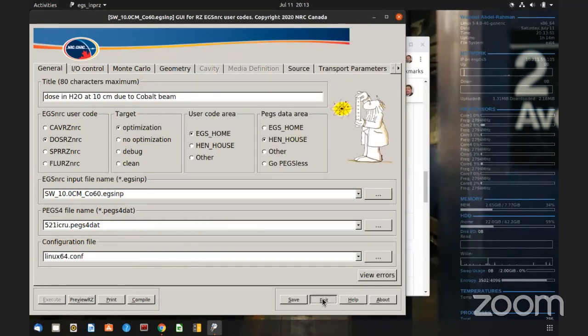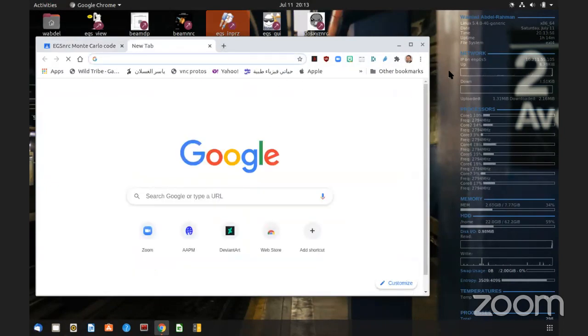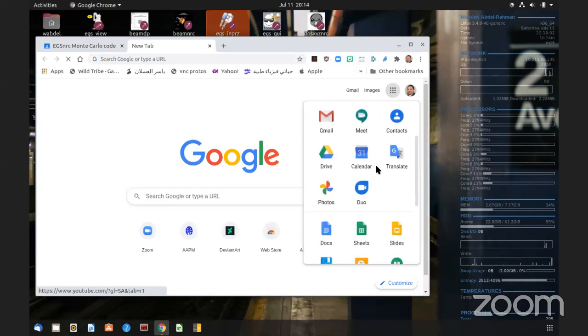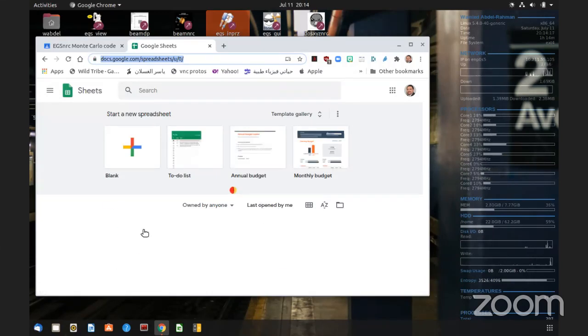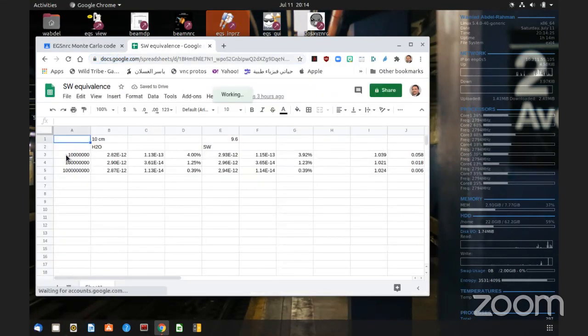And I ran the simulations, and let me show you the results. So here is the number of histories.